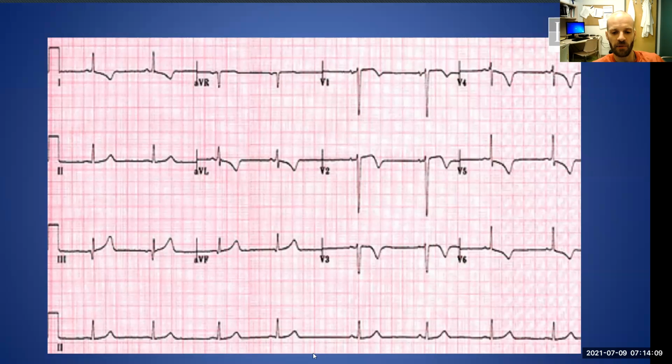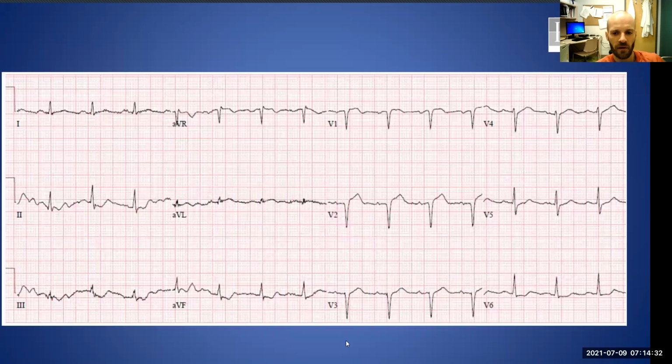So this is a sinus bradycardia. We've got one early beat. So this is a premature atrial activation, or premature atrial complex. So it's a PAC, early P wave here, but otherwise it's a sinus bradycardia. And you're absolutely right, there's anterolateral T wave inversion, and I would agree that these T waves are pretty pointy in lead 3 as well. Very good. Next.